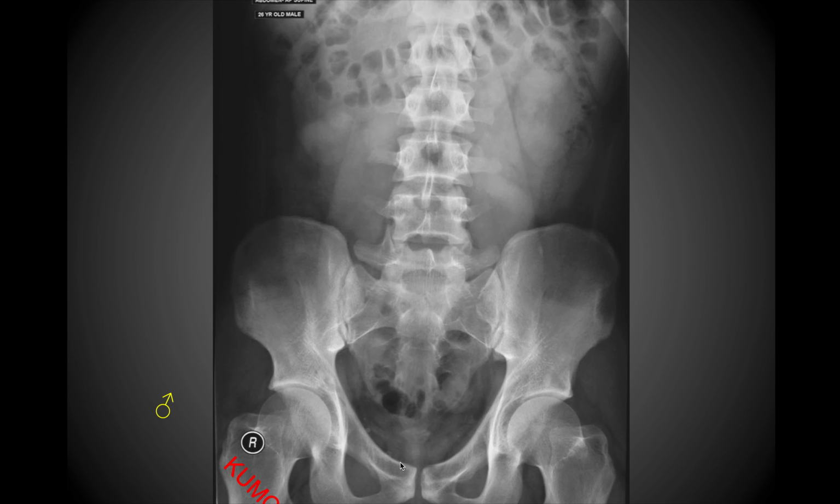And finally, we're going to look at the pelvis, the bony pelvis of a male versus a female. So just to remind you of some of the differences of what a female versus a male pelvis looks like. But before we jump into that, I just wanted to point out the clear outline here of the hepatic flexure, the transverse colon, and then the splenic flexure located right here in this patient. You can also clearly make out the psoas major muscles, and the margins of the right and the left kidneys.